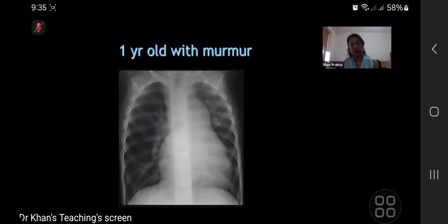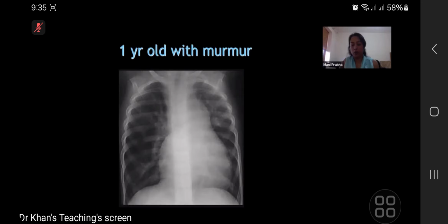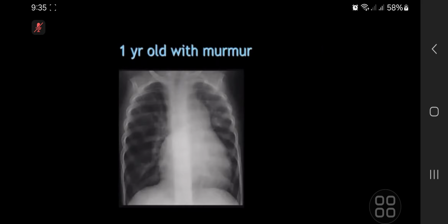With a left-sided aortic arch. Would I be able to ask, I assume with the 1-year-old child, this is probably an acyanotic heart disease? You are absolutely right. That's how you have to judge it, and it is acyanotic. So this would probably be most in keeping with a VSD.